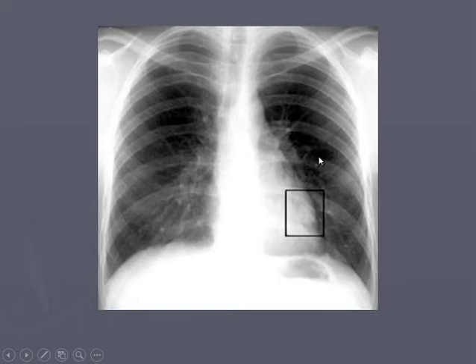As I mentioned, sometimes tumors can hide behind the heart. Here's one right there. If you didn't have that box around there, that'd be very difficult to see. Again, you have to be very careful and be very diligent in looking at every spot. Once you know what normal looks like, you say, I don't usually see a round little bump right there on the cardiac shadow. But if you were just doing it in passing, you could very easily miss that. And that would go from a curable cancer to a non-curable cancer.